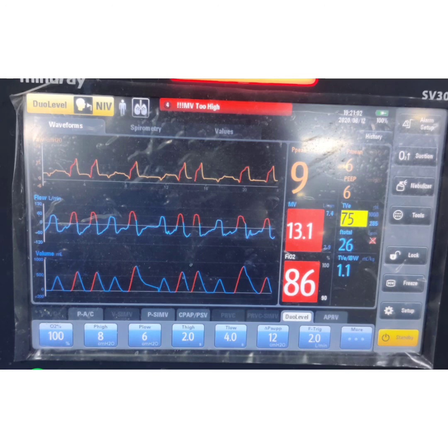And one more thing is, if during low pressure time spontaneous breathing is occurring, it can be supported by pressure support as indicated in this ventilator setting.